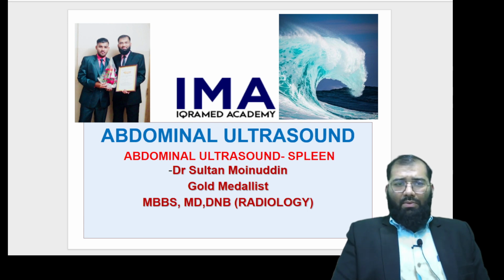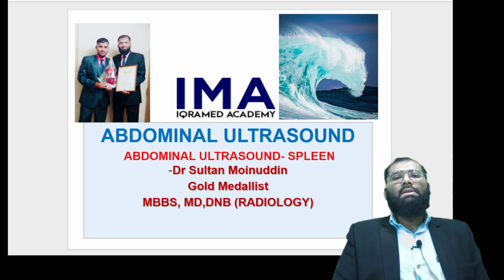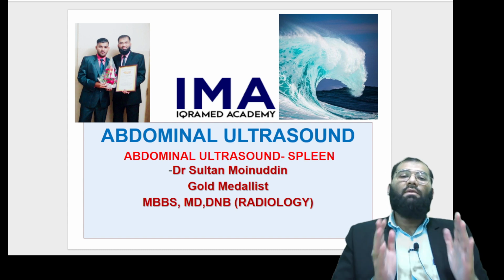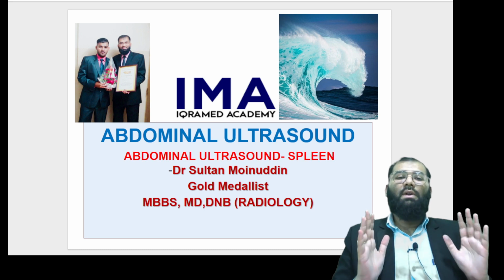When it comes to examination of abdominal ultrasound, today we are going to discuss a very important finding, not a pathology. Many of them mistake it as a pathology found on ultrasound. No, today we are going to discuss splenomegaly, which is in itself not a pathology, but an abdominal finding. Splenomegaly itself is not the diagnosis. It is one of the findings which can lead you to a diagnosis.